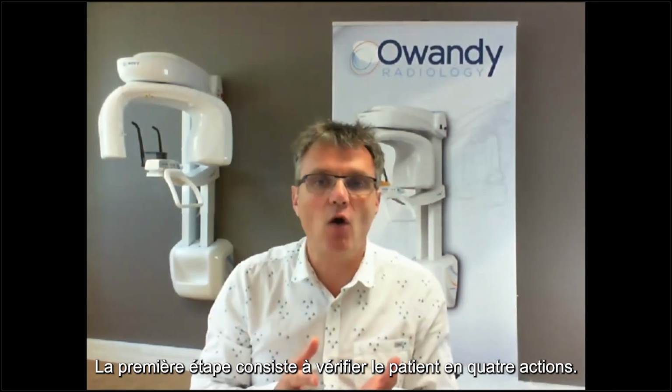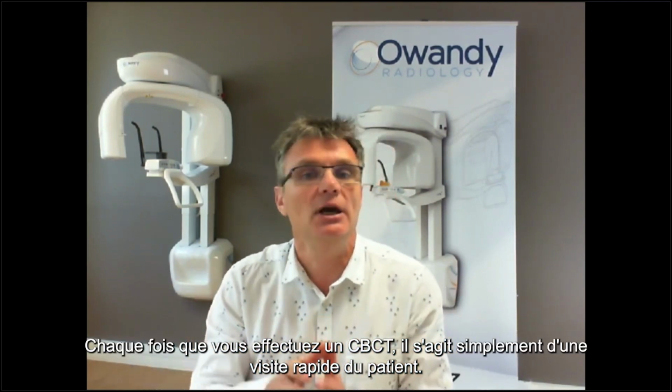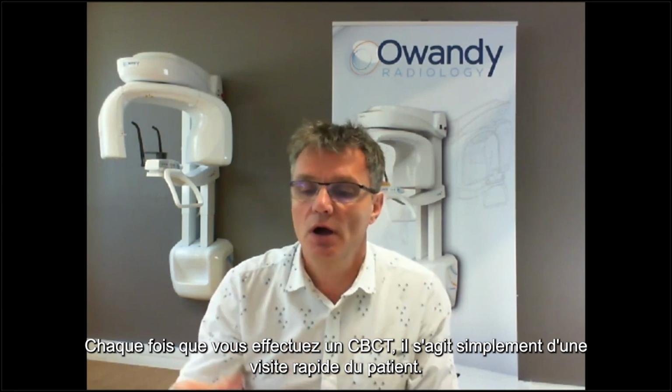First step is to check the patient within 4 actions. Okay, we'll check first this area here, and then that area here, and that area here. 4 actions. This is very fast. Each time you do a CBCT, it's to make a quick tour of the patient.